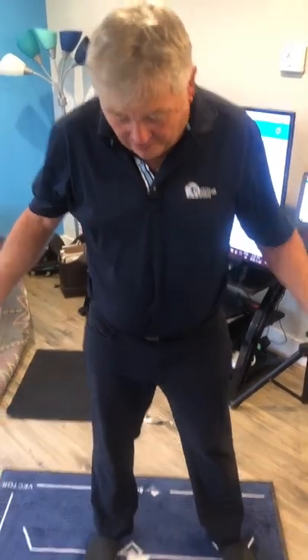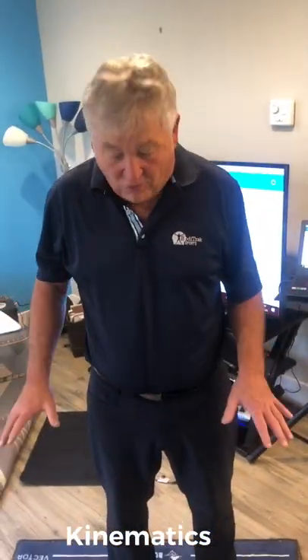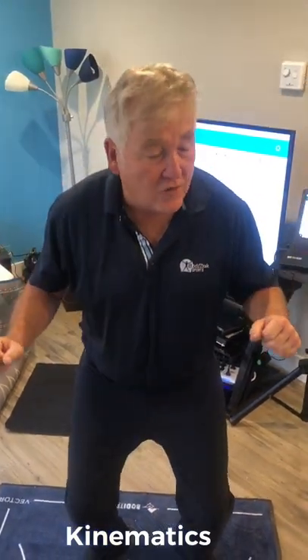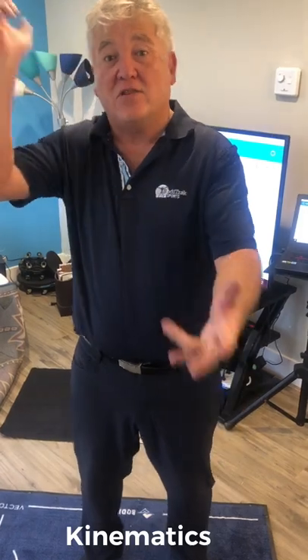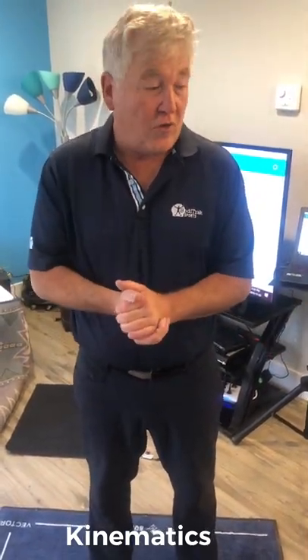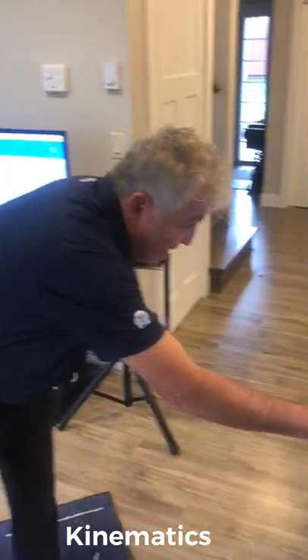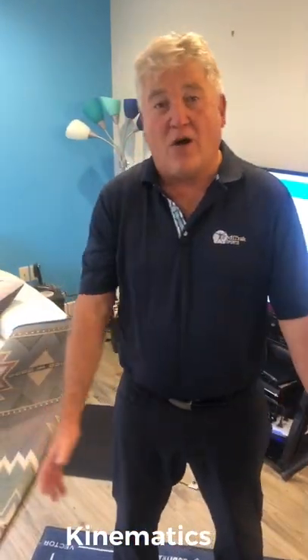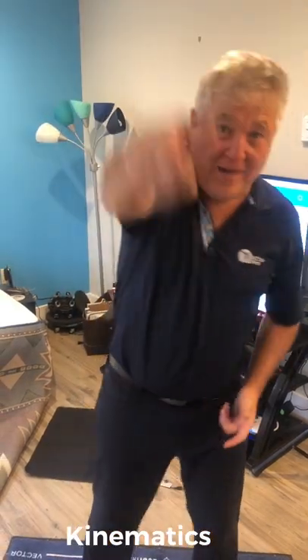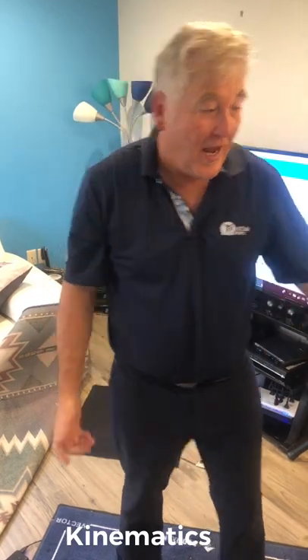So as you can see, we've got a lot of wireless connectivity going on here today, and I'm going to show you something because a lot of you already have a BodiTrak2 pressure mat, and you may be using it for squats, you may be using it for training, you may be using it for tennis, and some of you even for hockey. But today I'm going to show you something that we've never been able to show you, and I'm very proud that we can. So I'm just going to hit save for 10 seconds. I'm going to simulate a golf swing. I'm going to simulate a tennis serve. Imagine me playing tennis. And I'm going to simulate a left-handed hockey shot.